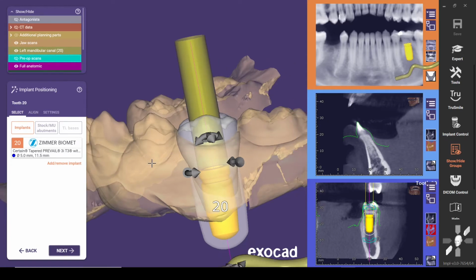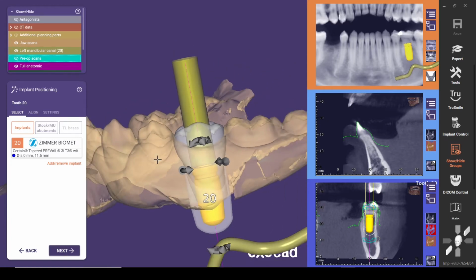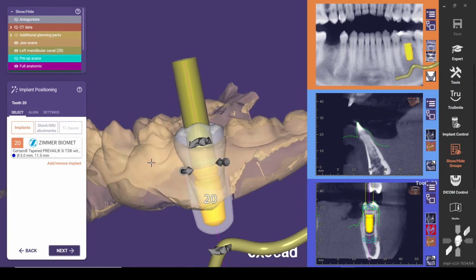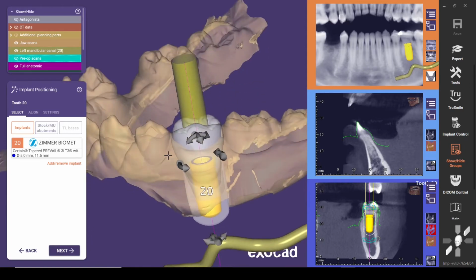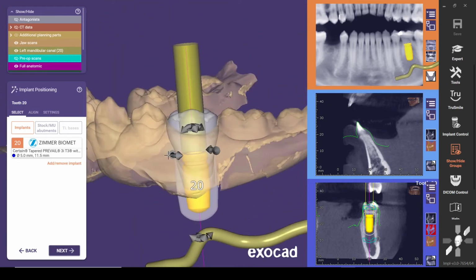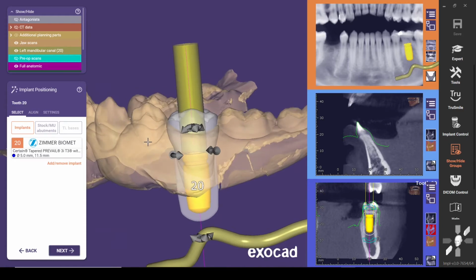And on anterior, the range in my world is about 3 or 4 millimeters apical to the gingival margin. That's where I'm placing my implant. So as soon as you start doing guided surgery, you start placing your implants much deeper probably than you ever did, or you're asking your surgeons to do that than they ever did before.